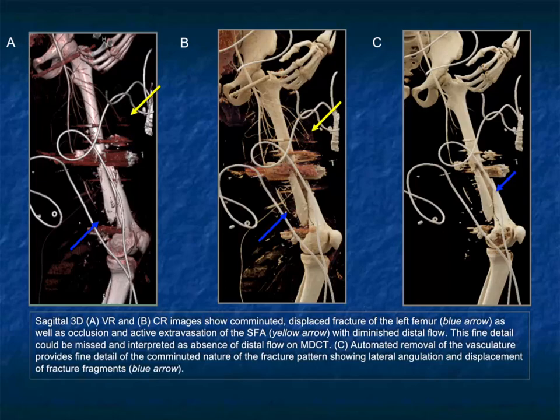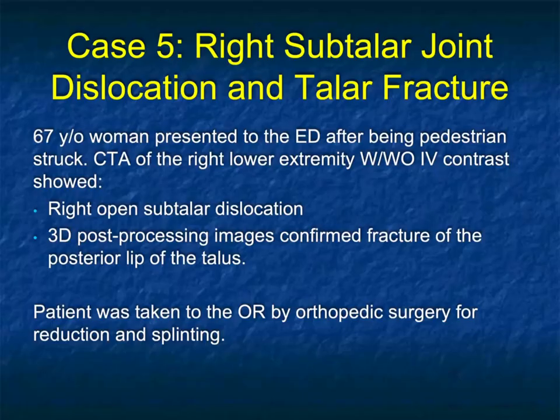So again, you can do predetermined or predefined 3D reconstructions. People will often do this with 3D labs, and I think that it works out well in most cases or in many cases, but I think the ability to create select 3D images becomes very, very important, and that's why the radiologist needs to be involved. I think the techs can do a great job, but the radiologists know and understand what you're looking for. Also, we find that the referring docs, particularly the orthopedic surgeons or vascular surgeons, like to look at the images themselves as well.